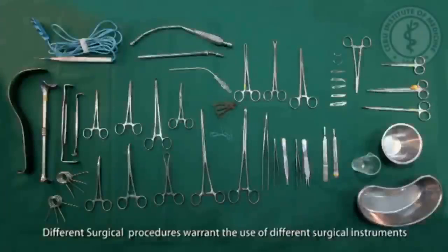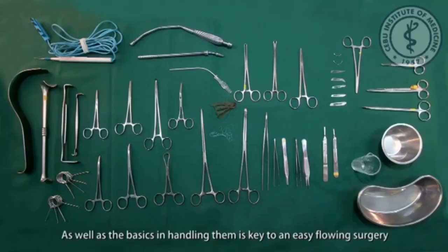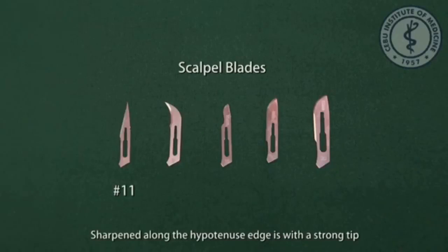Different surgical procedures warrant the use of different surgical instruments. Knowing each instrument and its functions, as well as the basics in handling them, is the key to an easy-flowing surgery. Scalpel blades. Blade holder. Blade number 11, also known as the stab knife, with its elongated triangular blade sharpened along the hypotenuse edge, comes with a strong pointed tip.